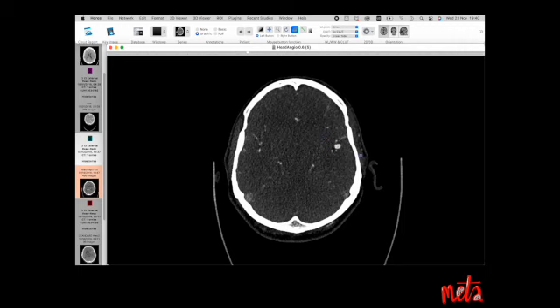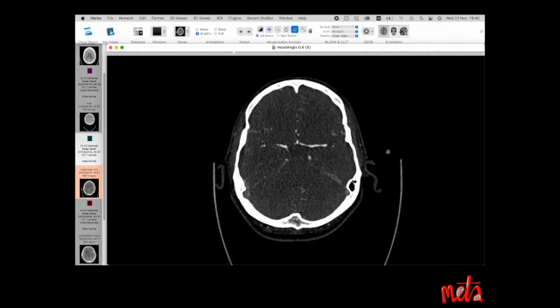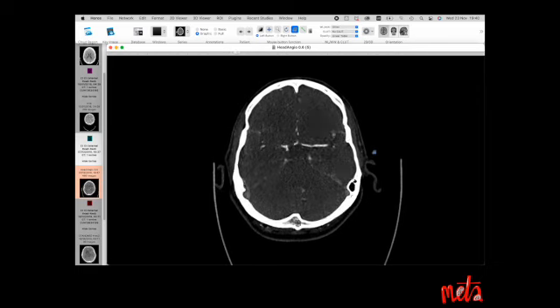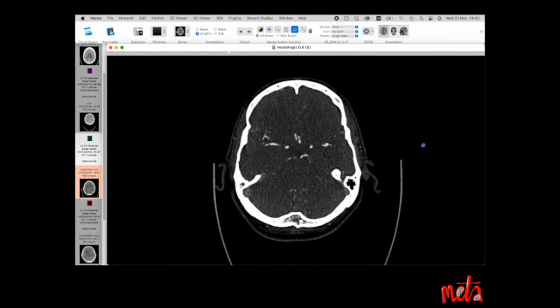So now we're going to show you some real world examples. This is a CT angiogram that actually has three intracranial aneurysms, a left MCA aneurysm, a left anterior temporal aneurysm shown there, and here a right posterior communicating artery aneurysm. And we're going to measure each in turn.